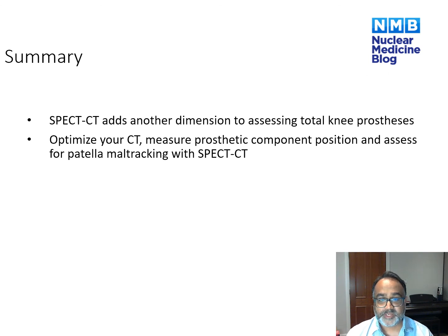So I hope I've been able to explain to you how SPECT-CT adds an additional dimension to assessing the total knee prosthesis. I would urge you to optimize your CT, add in extended Hounsfield units and small field of view imaging. I would suggest you look at how you can measure the prosthetic component position and also look at measuring patellar maltracking with your SPECT-CT.